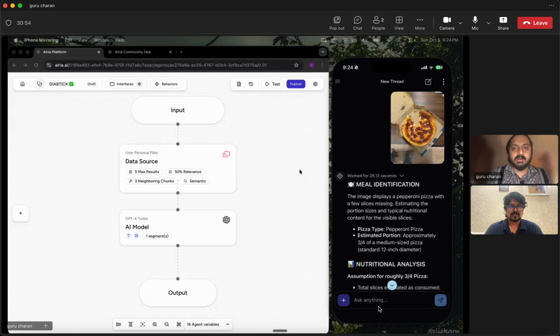So basically, you can visualize from my screen, right? On the left side, we have the Airia platform, which makes it pretty simple for us to understand as well as develop an AI agent on their platform to help support this great cause. The input would be the users sending us the image with some contextual data, let's say about the age, or something special they want to inform, which would affect the calculation for the insulin dosage.